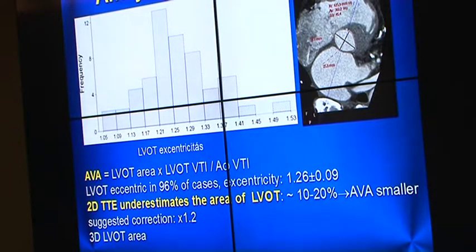We do know that the aortic root is not circular. It is ellipsoid again. That's why the normal quantification of the aortic valve area from 2D echo is inaccurate. The 2D echo always measures from parasternal window or from long axis TOE this short diameter. But it's not circular. We have a long diameter of the root.